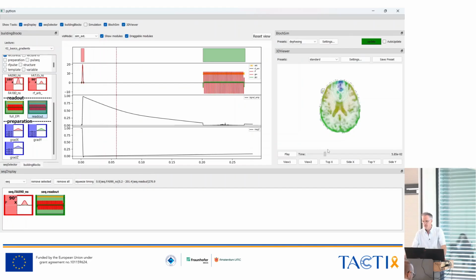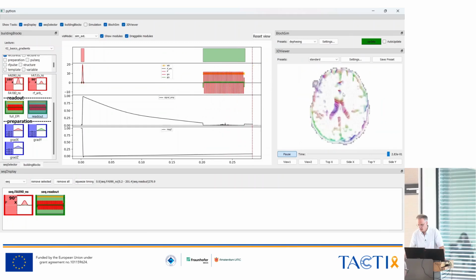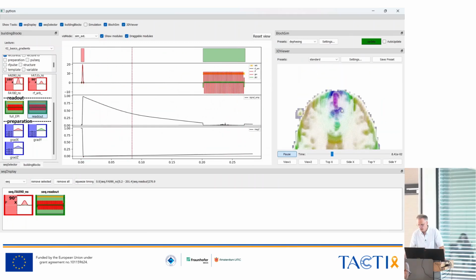And you see that this effect of the different phases, the longer you wait, it just adds on to the additional phase. And it even affects at some point regions which are quite far away. But in normal imaging, you won't realize it because the changes are so small in phase that it won't affect your imaging. So the most affected part will be that region. And then going through the imaging, we're switching different gradients, so getting different wave patterns. That happens quite quickly. But what we could really look into is this region up here.